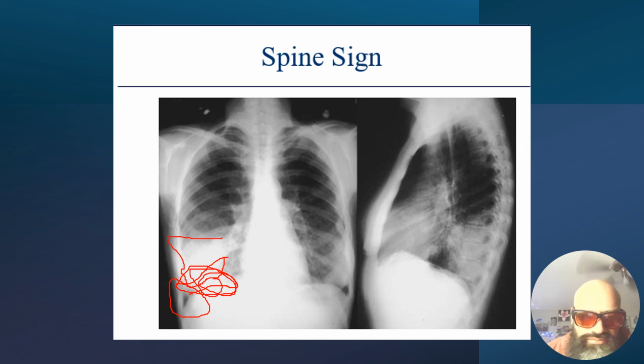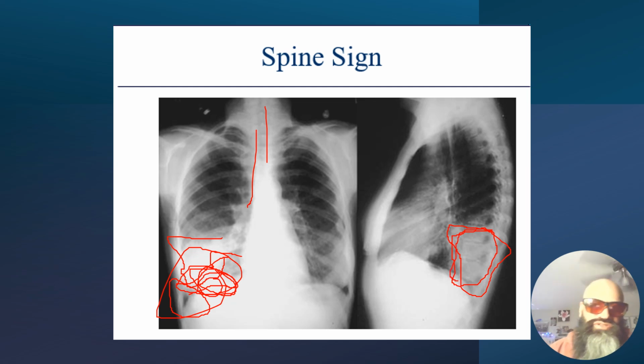Then we find your trachea, your carina. We'll get the lateral view. This fluid density here, we're now able to see it here, and it is obscuring the lower thoracic vertebra, making it appear white when it should appear dark.